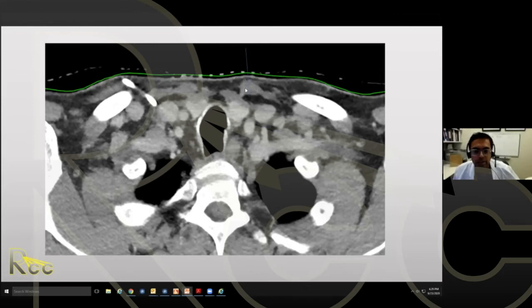It actually moves anteriorly and goes medially here. We have the subclavian artery here, vein. This is the scalenus muscle. Where it was here before in the head and neck, now it has moved laterally and forms that lateral border. There's the medial edge of the sternocleidomastoid muscle, the medial edge of the common carotid artery.